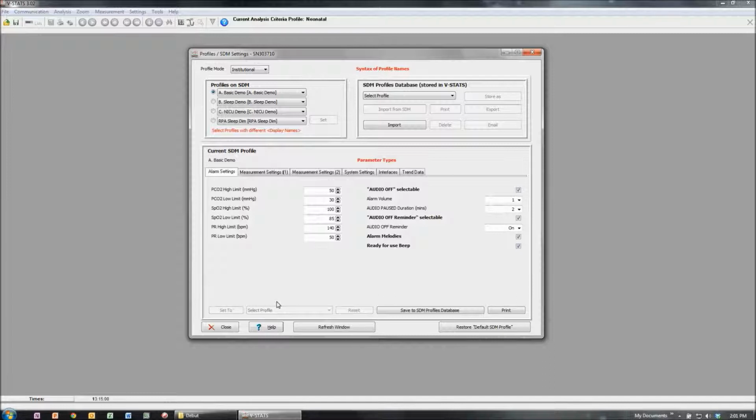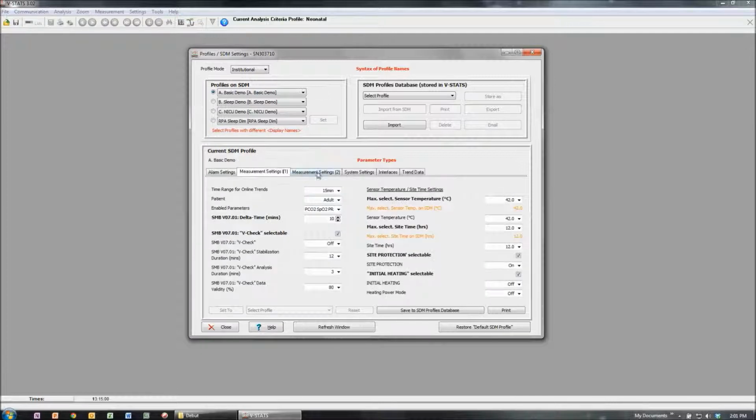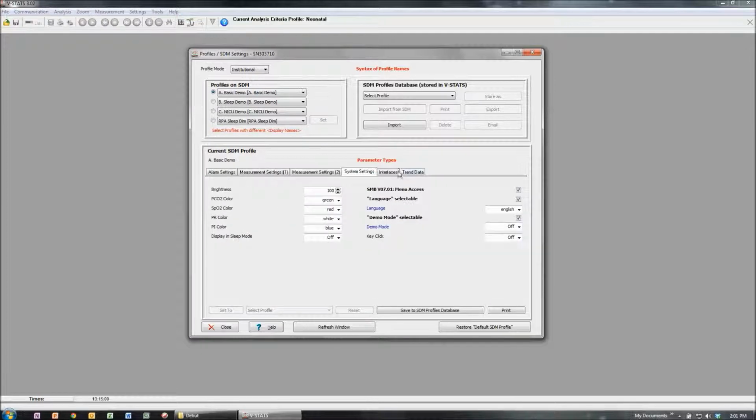These down here in this dialog box is where the current settings are on the device that the computer is actually talking to. Again, so this is all current. This is exactly what's on the device, and we can scroll through all of the different tabs. Don't pay too much attention to what's on there at the moment. We'll go through them in a minute.